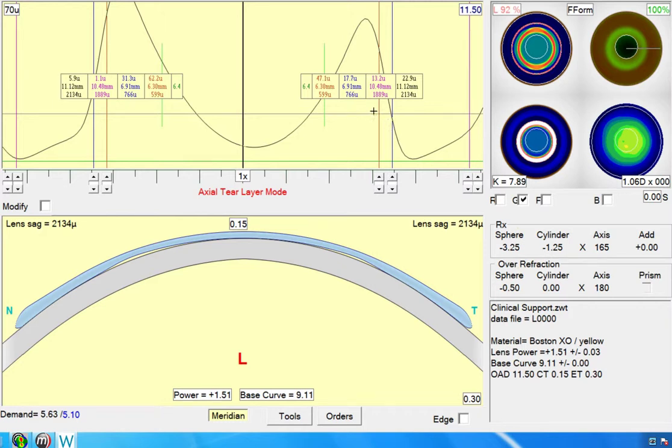So we'll just look at our starting point. We're at 766 and 1889, and we got a target about a 10 to 12 micron increase here at the IC point, the blue control point. So let's say we do 10, we'll end up with a target of 776. 1889, we don't want that to change, and so we will have to make an adjustment to compensate for that afterwards, but we'll make this change first.